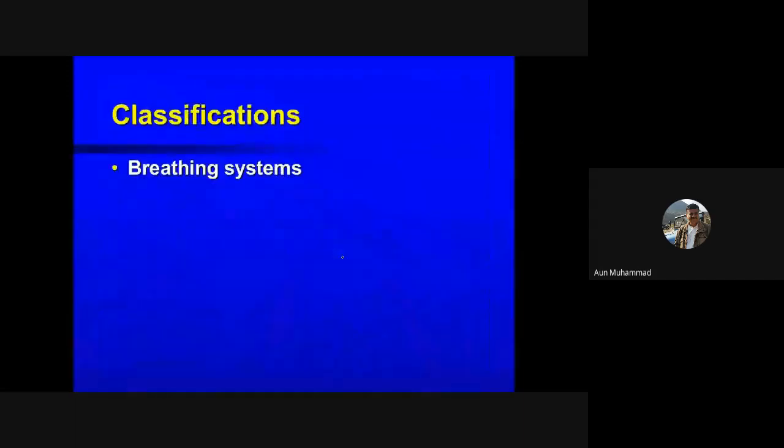And finally, next is the breathing system. Breathing systems are further classified into four categories: the open breathing system, the semi-open breathing system, the semi-closed breathing system, and the closed breathing system. All these breathing systems have their own importance. They have their own plus points and negative points. So I will be giving you a brief introduction of all breathing systems.